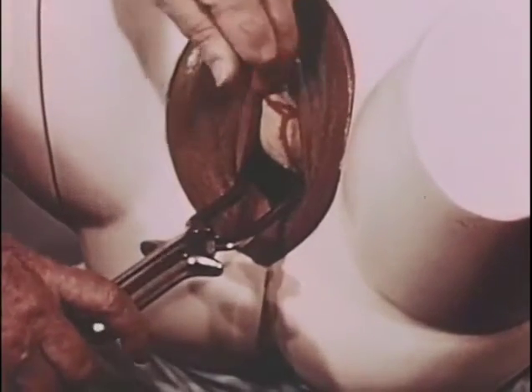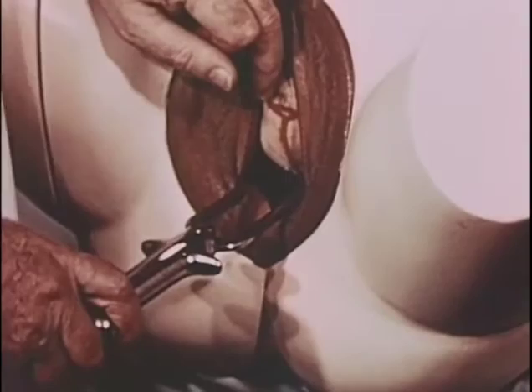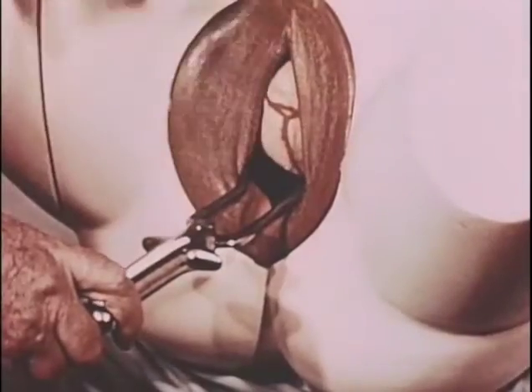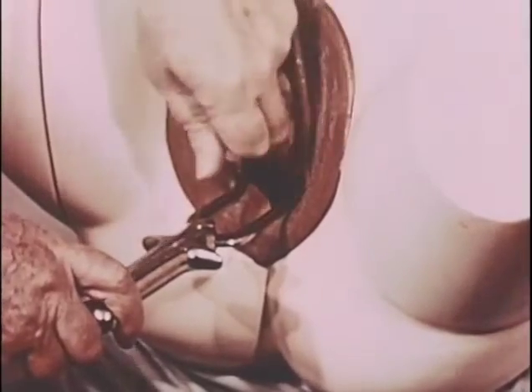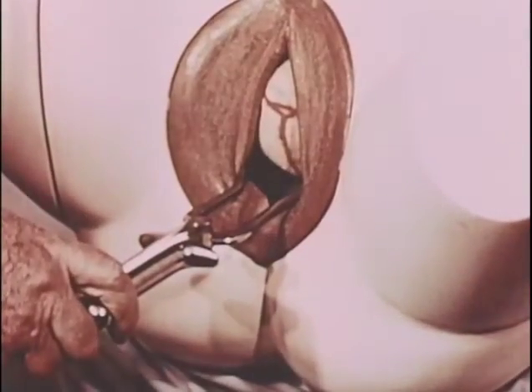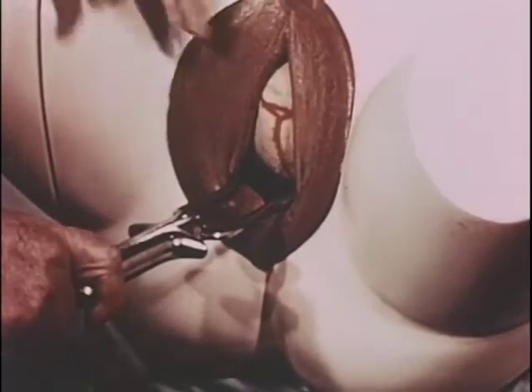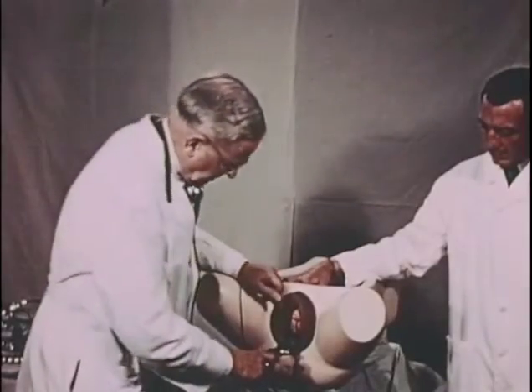And the pivot point of the head, the middle of the biparietal diameter, is anterior to the biparietal diameter of the forceps blade. Hence, traction will cause further extension and interference with delivery.